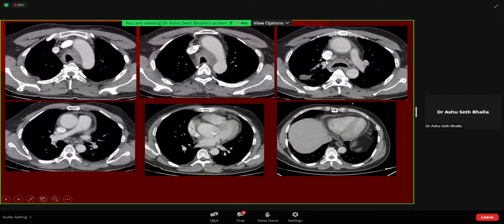You see this very, just like you see in Crohn's disease, in the abdomen and bowel, as a very mural kind of stratification. You're getting a very similar appearance here, a very mural kind of stratification. And what I noticed is that if I'm looking at the aorta also, for instance, this is not a partial volume averaging. There is something wrong. The wall of the aorta is not clean. The wall of the aorta is not clean. And then when we look down, there is some pericardial thickening also.